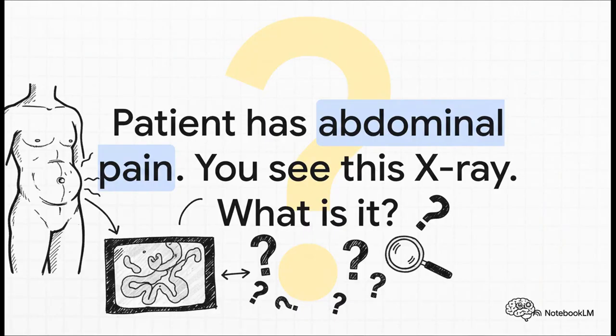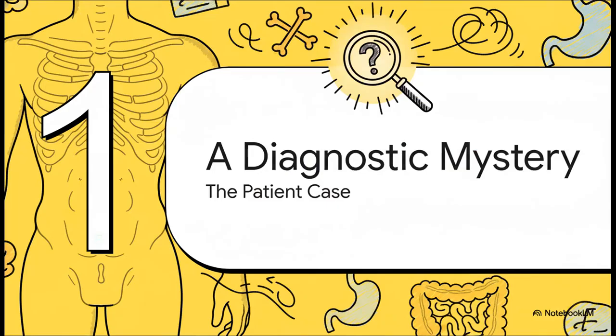Okay, let's just jump right in. You've got a patient who's in real trouble. Their belly is painful, it's swollen, and you need answers fast. You get this X-ray back. At first glance, it looks intimidating. But don't you worry, we're going to treat this like a diagnostic mystery, and we are going to solve it together, step by step. So, first up, the mystery itself.